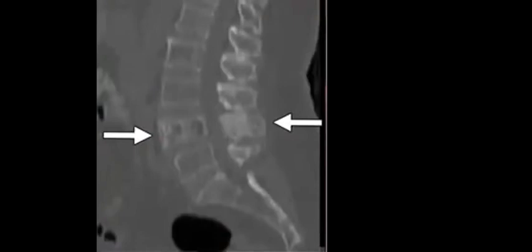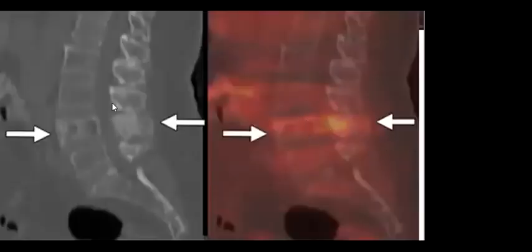Nice, perfect Hiba. So Paget's. Paget's is one of the important pitfalls that could happen, similar to metastasis. Sure, metastasis still will be an option, but just to know that not everything is metastasis. So you should eliminate the color and go to the CT image and check carefully.